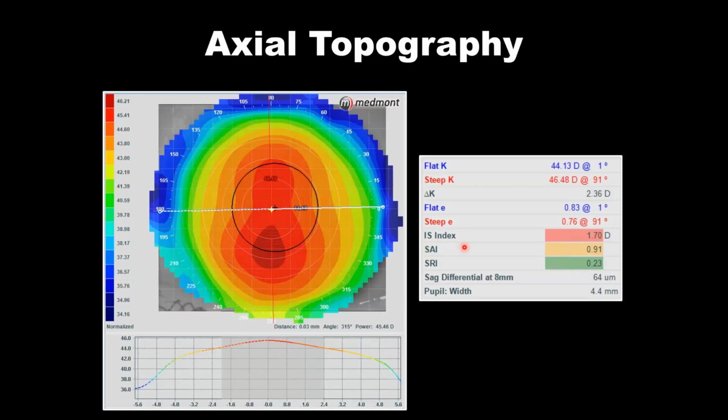Let's switch over and talk about the topography capture, the surface area of capture. And here we see our composite topography. The reason why I personally love this map so much is that it gives me the ability to understand central cornea, the peripheral or mid-peripheral cornea, where a rigid contact lens is going to touch down. So if I'm using the contact lens software, I understand the point where the lens lands. And then we get this far peripheral cornea right at the limbus or the visible iris diameter border. And that allows us to predict the sagittal depth of scleral lenses.